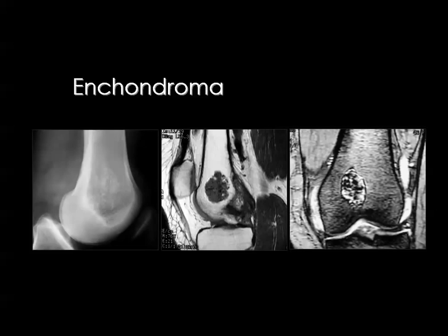And finally, as I see frequently in reports, it may recommend the lesion to be biopsied, either by CT guided or by surgical biopsy. I want to say that this lesion is an incidental finding in many cases and is not responsible for the patient's complaint.